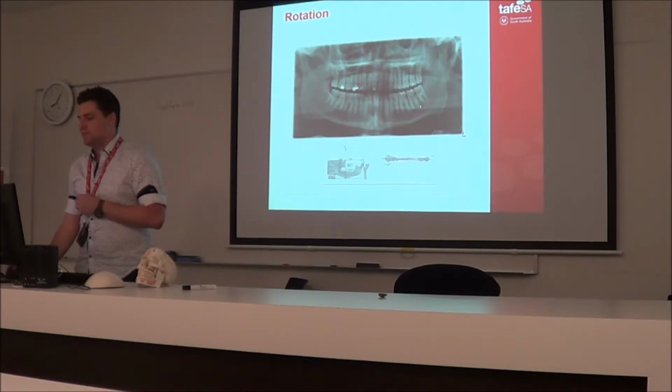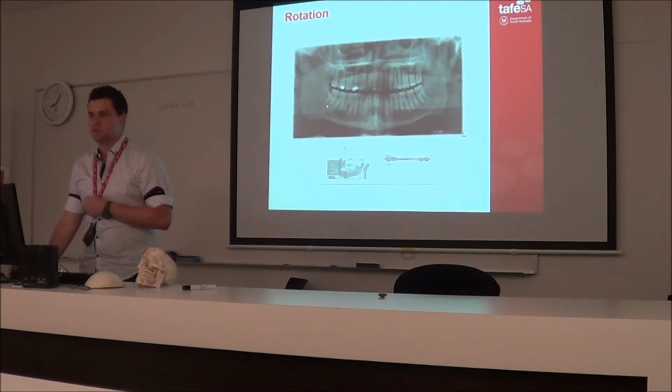So here you can see we've got this side being too skinny, this side being too wide, this side is too far away from the actual sensor. And so notice how the mandible increases in size. So notice how the ramus is a lot wider here.